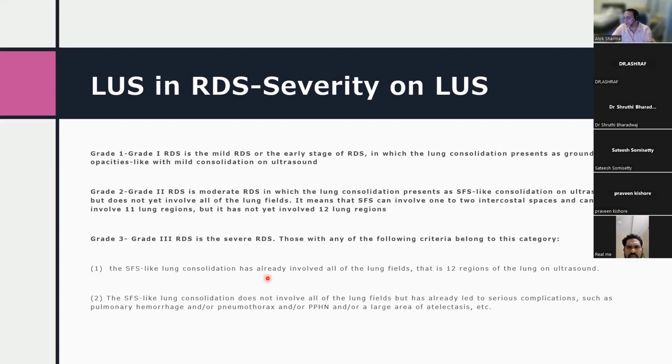And this is quite important, because if you start seeing either of these two situations, grade 2 or grade 3, in a baby where there are clinical symptoms, then the question from your perspective is, do you really want to wait for an FiO2 to reach 30% if you're doing an ultrasound in the first 2 hours, or you may really want to give surfactant early? And that might, from our perspective, allow a plausible improvement in this baby, which then means this individual baby has a better clinical course.